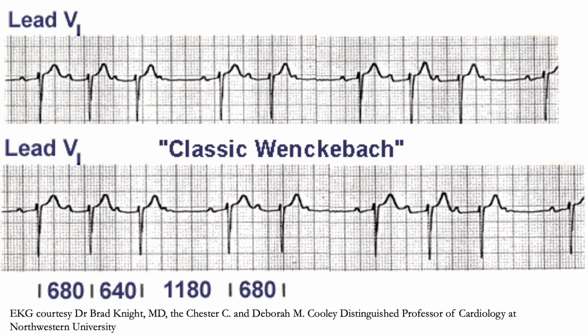The EKG is courtesy of Dr. Brad Knight, MD, the Chester C. and Deborah M. Cooley Distinguished Professor of Cardiology at Northwestern University in Chicago. And here you'll see the PR interval prolonging till there's a drop beat.